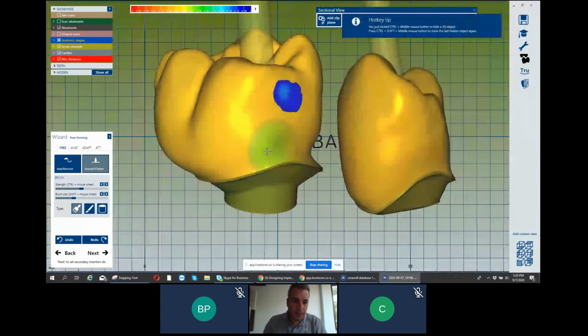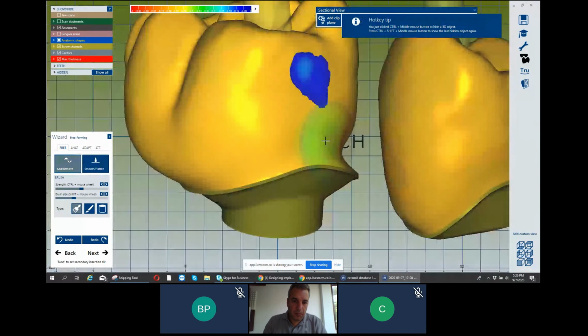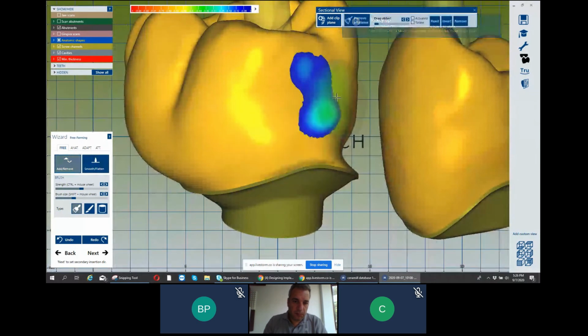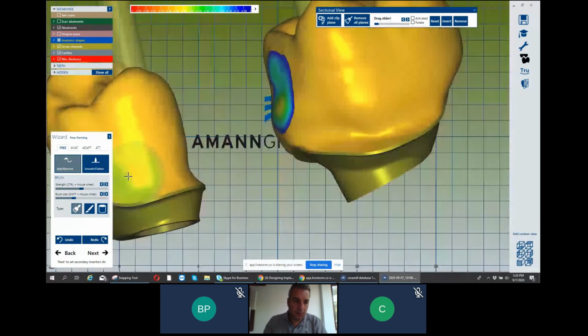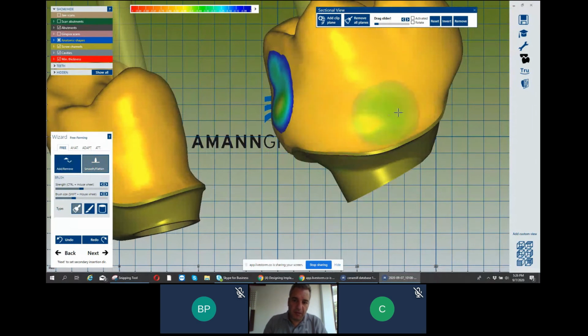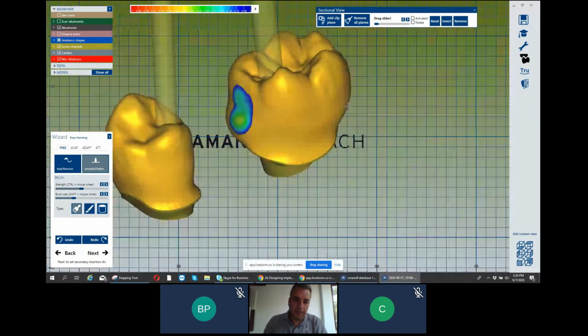You should follow. Always before adding, you should remove. Smooth first, and then add all the material.